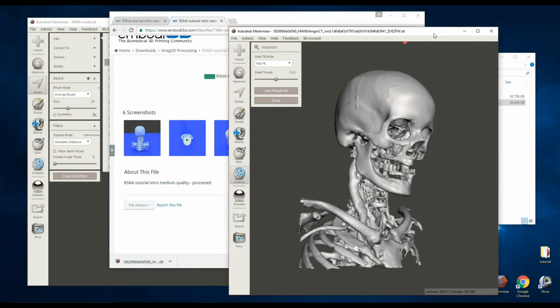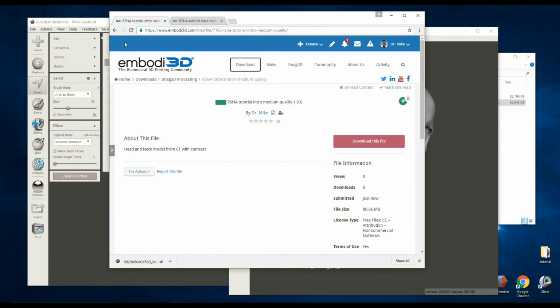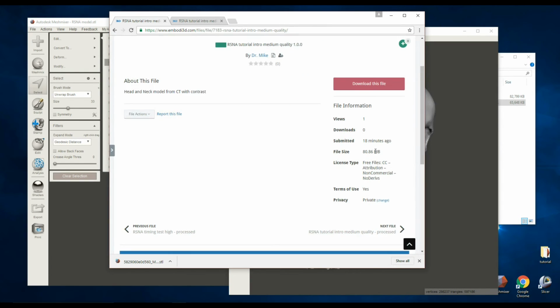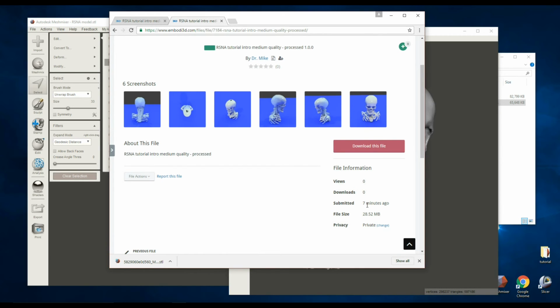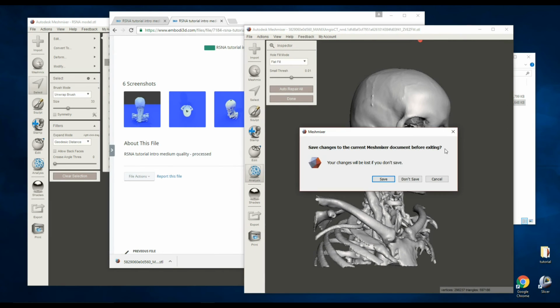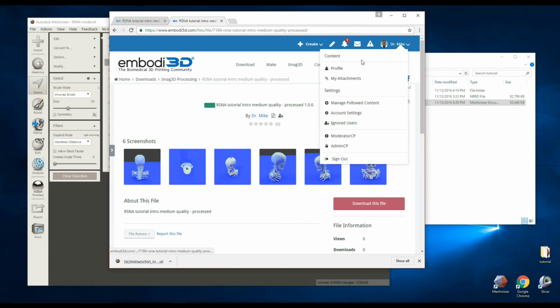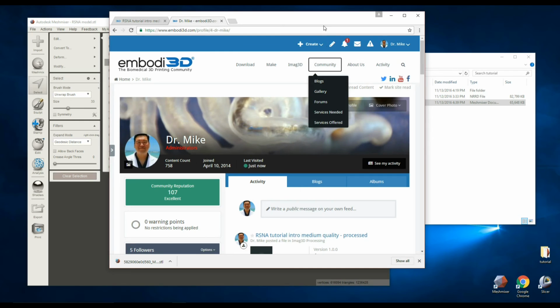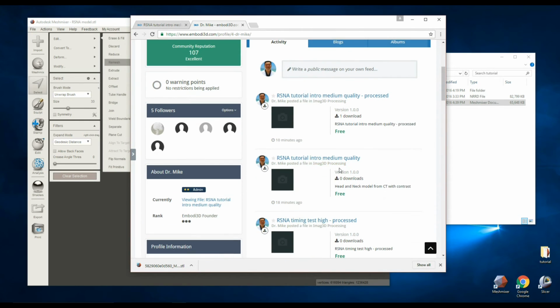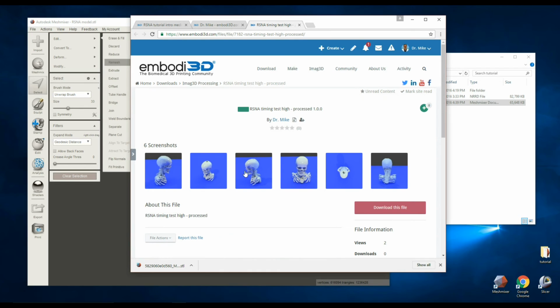So we did that in about, how long did that take? We uploaded the file 18 minutes ago, and it was completed 7 minutes ago, so it took 11 minutes to process. So that's pretty good. Now, we don't need to save that. Now, before I recorded this video, I did actually create a high quality version of this file, which we can download and compare.